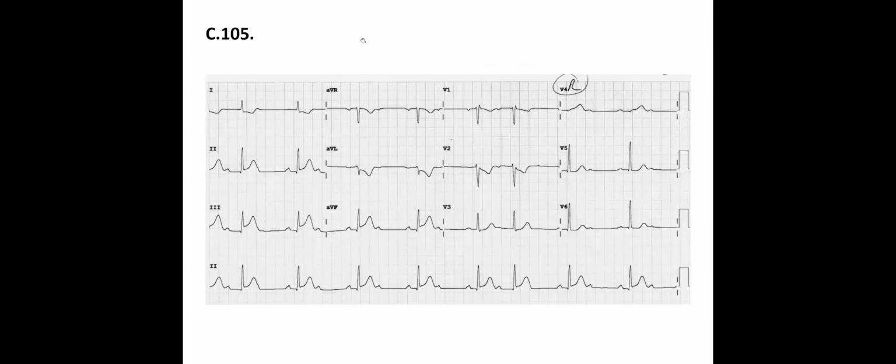Let's see. Next one, 105. Anybody had? Yeah, that was mine.